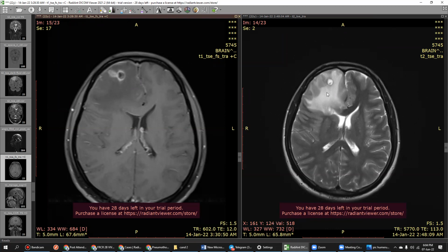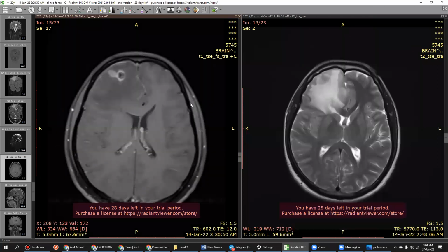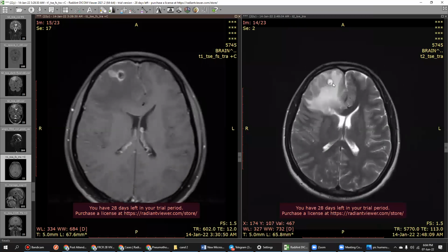Only in the colloidal stage you'll have a lot of edema. Granular stage you'll have enhancement but no edema. In nodular calcific, only calcification. Understood? Yes. So this was NCC. So you should not miss this. Whenever they're pointing out a black thing, this is a scolex and this is the separate thing.